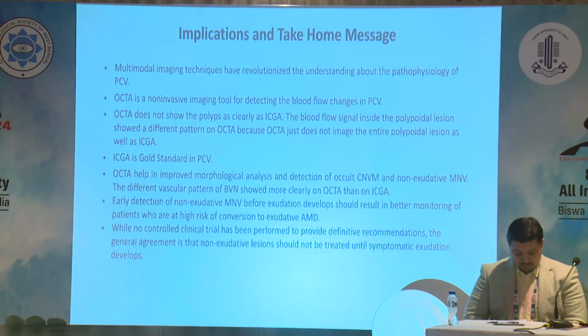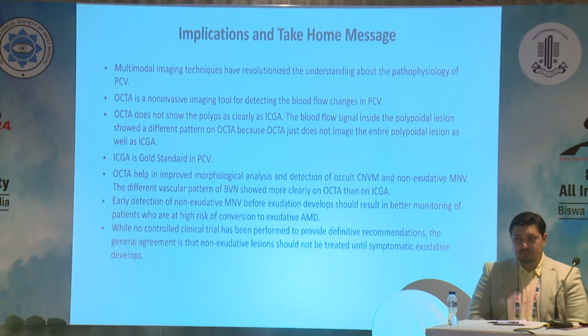It will only detect the blood flow in the large PCVs at the periphery, and you will not have a well-defined polypoidal pattern, but you may have a ring or a half ring or a cluster of white dots depending on the blood flow which is present, and can easily miss small polyps. So ICG still remains the gold standard for detecting PCV. But you can avoid it in your private clinical practice at least. Maybe in an institute you can do it in every case.